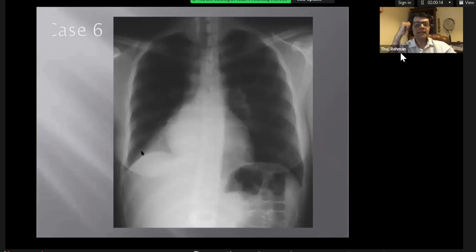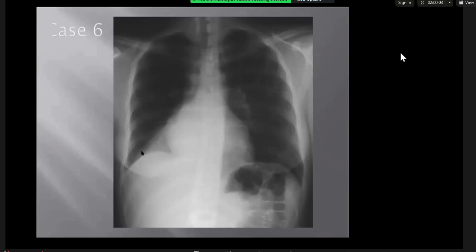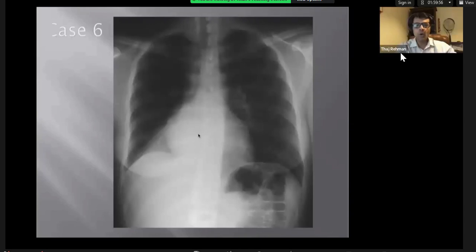And something that we discussed earlier about comparing lung vascularity. Did you compare the lung vascularity on both sides in this case? I know it's a bit dark, X-ray. It's marginally less on the right side. It is, isn't it? The hilum is small and the blood vessels are definitely sparse on the right side. So put everything together, and you want to comment. You've done very well, actually. You have picked up all the abnormalities, just a bit of fine touch.